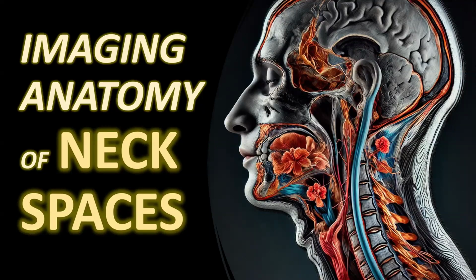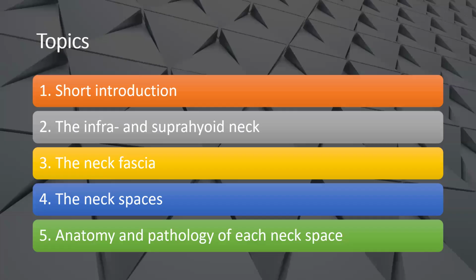I am a neuroradiologist working in Ghent University Hospital in Belgium, and welcome to this video presentation on imaging anatomy of neck spaces. In this presentation, I'm going to start with a very short introduction, and then I'm going to make, or try to make, neck anatomy easy, first by dividing the neck in a supra- and an infrahyoid part. Then I'm going to show you the location of the various neck fascia, and I'm going to use the neck fascia to divide the neck into several spaces. Finally, I'm going to discuss the anatomy of each respective neck space in a bit more detail and illustrate it with a lot of pathological examples.